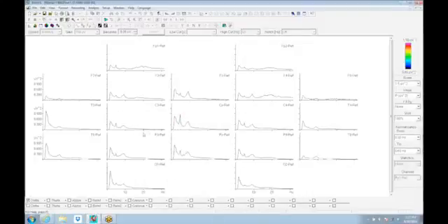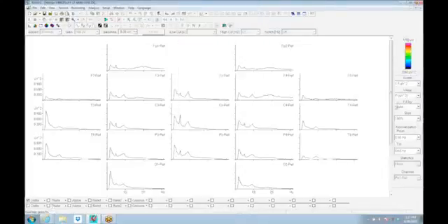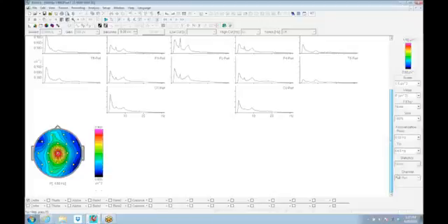It was blended over because you can't get that resolution with that small a timepiece as your epoch. So the added frequency resolution gives us additional insight. I mean, if you can't see that this case has a CZ issue here, you're missing the point. And that point is missing if you go to a low resolution.